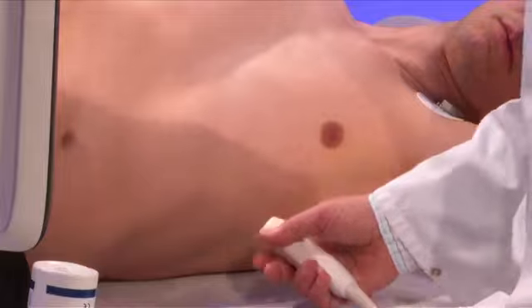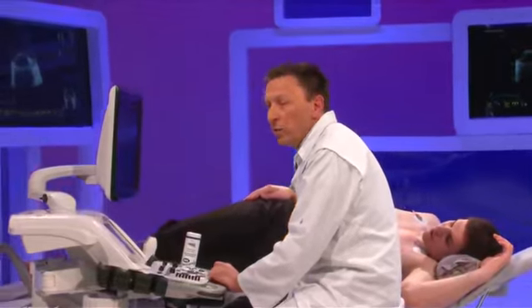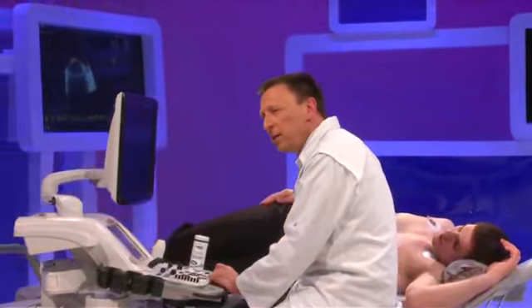So, to summarize this case, I think that it allows us to emphasize the importance of the loading condition in this combined condition. It's important to remember that we have to assess the effective regurgitant orifice, which is the best way to assess the severity of mitral valve disease in this case, and that we have to make the diagnosis between functional and organic mitral regurgitation, because functional mitral regurgitation is more likely to regress following an isolated aortic valve replacement.